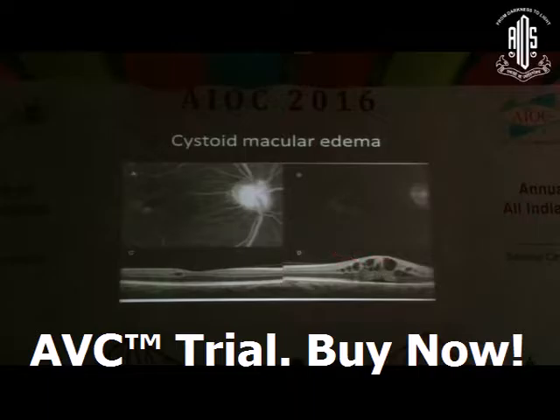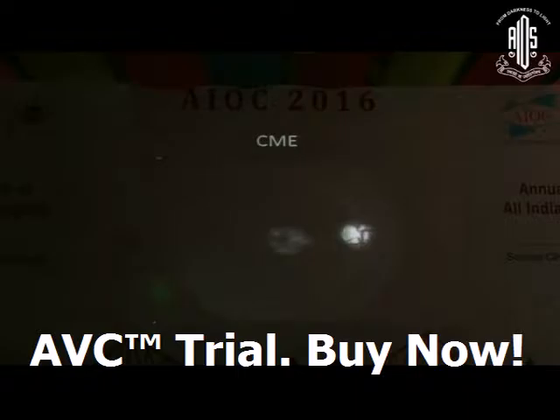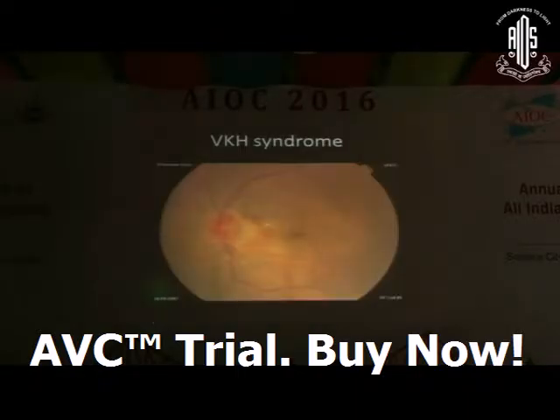And OCT of the same condition here. Ever since the advent of the OCT, FFA is less and less required, but if necessary, we can do that. Another picture of cystoid macular edema, similar petaloid appearance. So then, the first condition is VKH syndrome, Vogt-Koyanagi-Harada syndrome.